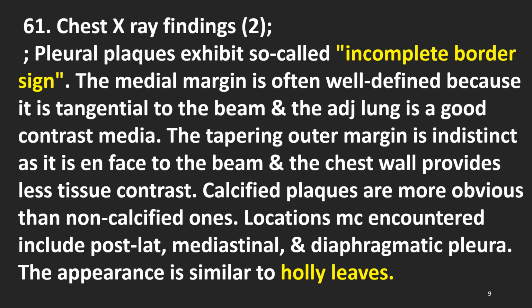Calcified plaques are more obvious than non-calcified ones on chest X-ray. Locations most commonly encountered include posterolateral, mediastinal, and diaphragmatic pleura. The appearance is similar to holly leaves.